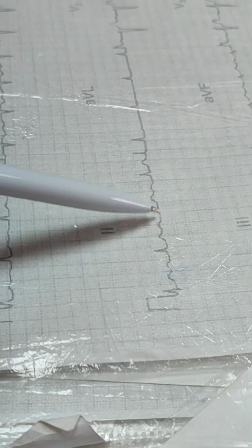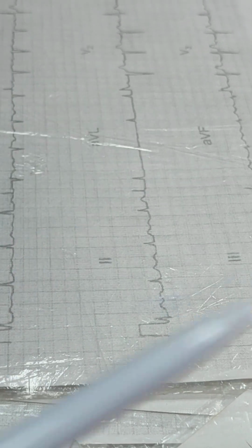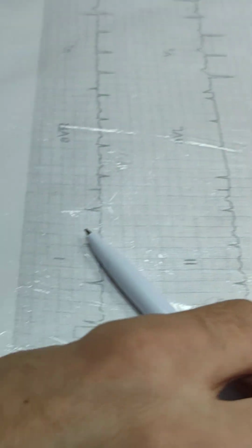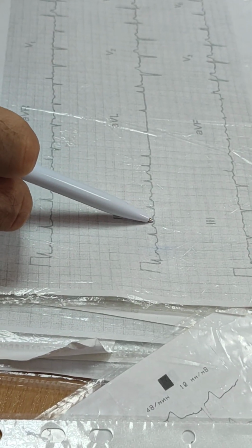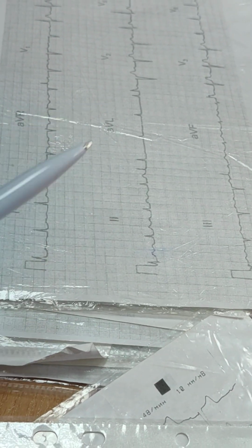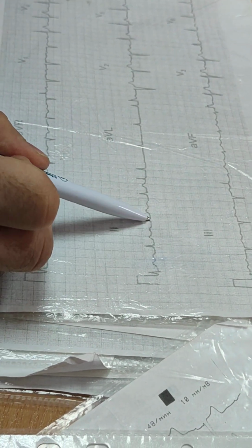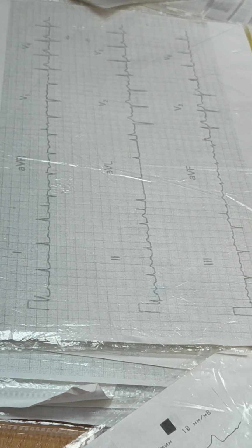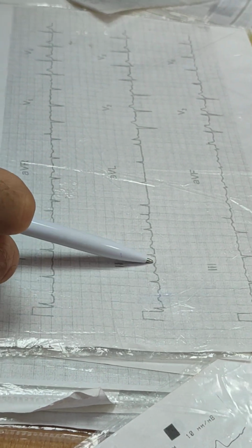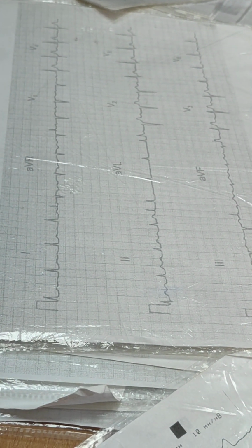This card: quality, P waves, regularity, and electric axis of the heart shifted to the left. This distance is too short. There is no electric line between P and T. Yes? So it is tachycardia exactly. Tachycardia, width of complex is less than 0.12 seconds. So it is supraventricular tachycardia. P waves are present. So it is sinus tachycardia.